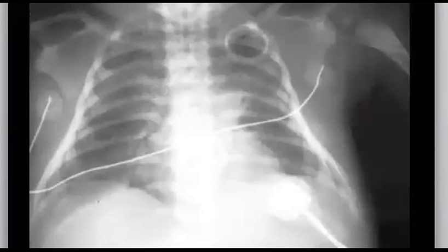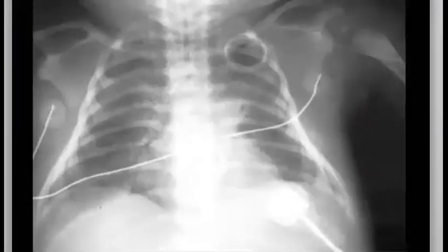Again, if you consider him full term, you can also confirm this with the ossification of the humeral epiphyseal parts. So you can think that he is full term. Again, here you can see opacities in both lungs, and he gives you a history that this patient already has fever and so on. Note also something here in the clavicle on the right side, so it's a fracture.